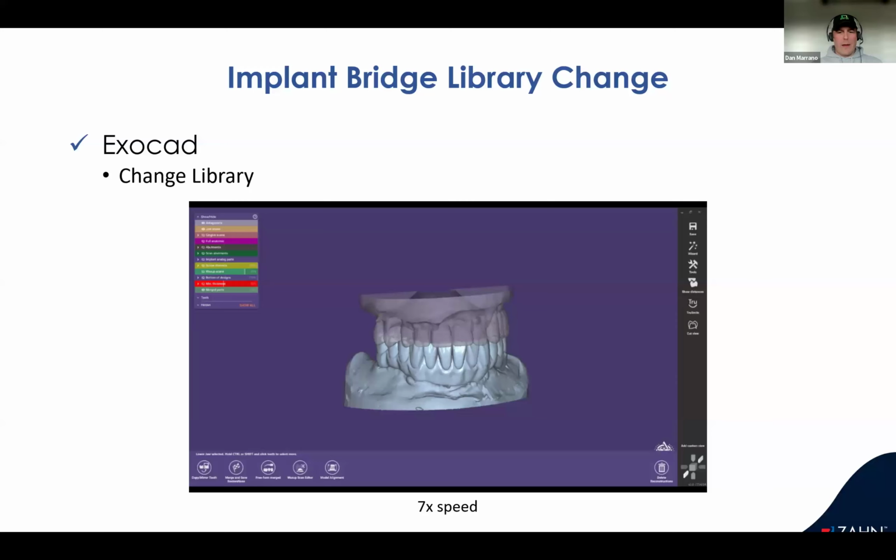You have to make sure your libraries are compatible with each other. Some of them will be rotated 90 degrees. If you don't have that problem, then you're fine. Just run it through. Nice and easy.